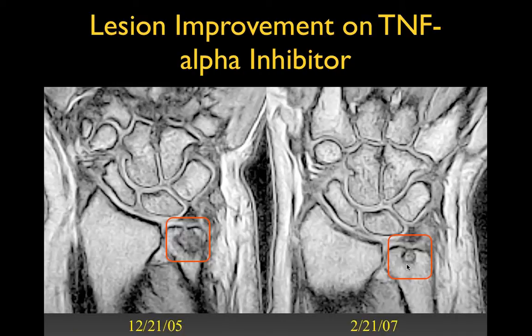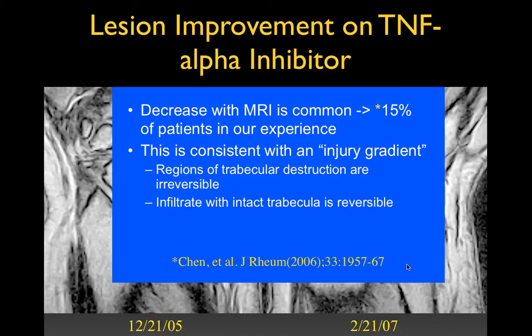Well, one is the one in the '05 study, and the other is a true erosion. And how about the fluid inside the joint space of the carpal row? Can you actually see the fluid very well with a low field scanner? You can, but you have to have a STIR sequence, and I'm not sure I have the STIR sequence with this. I don't think I have it, but you can, yes.